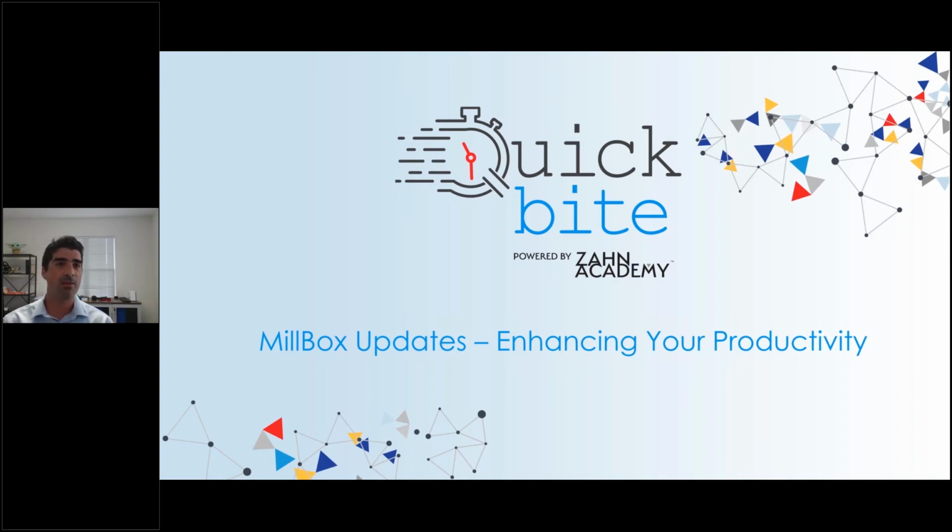I know we have a mixed crowd out here today, right? Some people haven't had any updates for Millbox in a long time. Some people try to keep updated. So we have a very mixed crowd. I just want to show you what you've been missing out on if you haven't updated in a while. Maybe you have updated and you just didn't know about all the features that are at your fingertips. So let's go through this together.